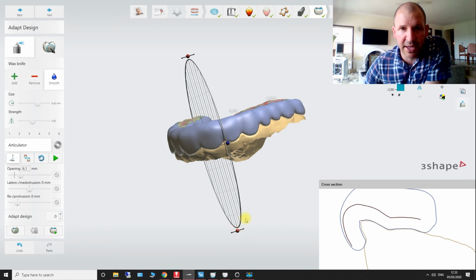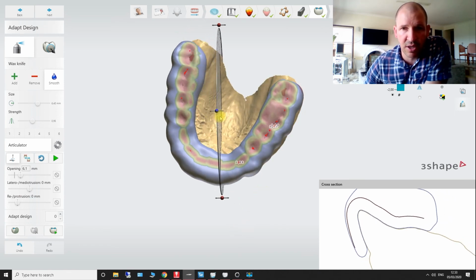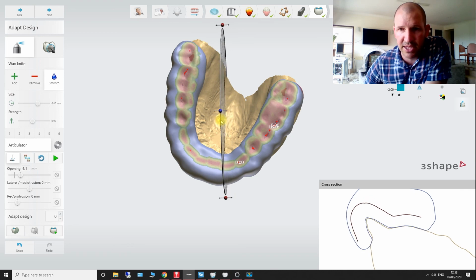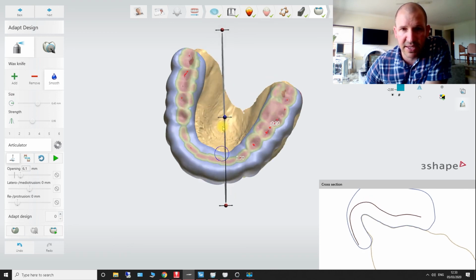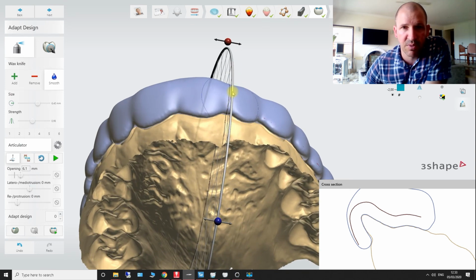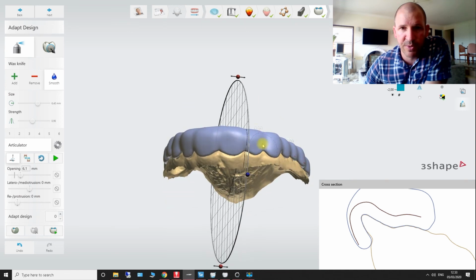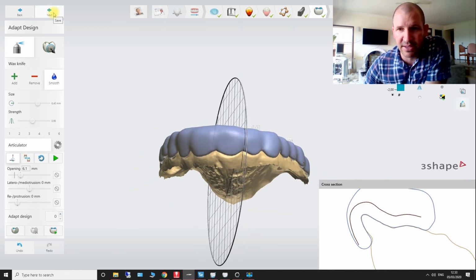That's just where I put my wax. But I hope that gives you some sort of an idea. You can just do a quick trim on that. You can see just in there, it does bite in a fair bit more. I noticed that, obviously. That's why since I've since done this, I've added a little bit more wax in the second time. But you can trim that out just with a burr.